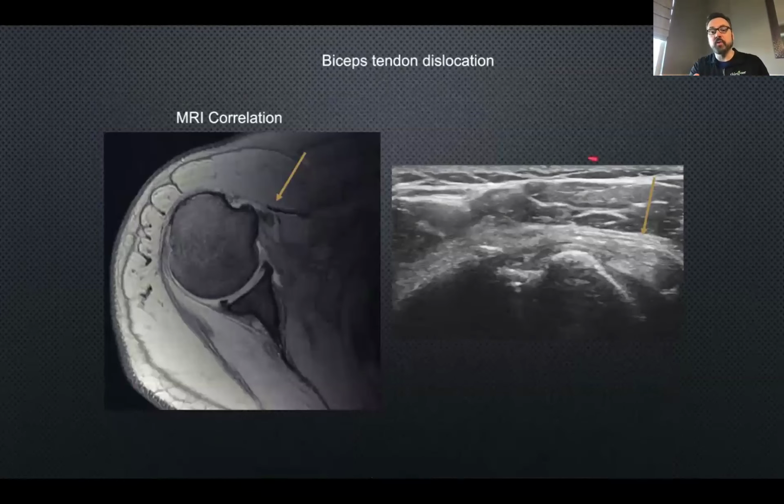And here, what this gave us was wonderful comparison between an MR and an ultrasound scan. So on the MR scan, this is that bicipital groove where you should have a little black tendon sitting in here, which would be the long head of the biceps tendon. But we can see the biceps tendon is sitting right here. It's dislocated, it's bounced out, and it's actually gone medial with respect to that bicipital groove. And this is the patient again, same patient, MR versus ultrasound. This is the empty groove, and we have the bicipital tendon sitting right over here. Okay, so this is wonderful correlation.